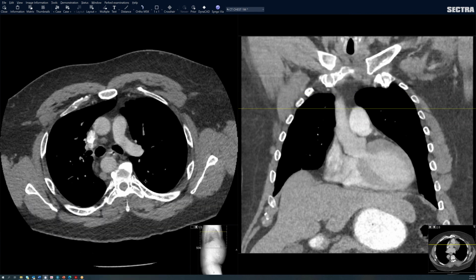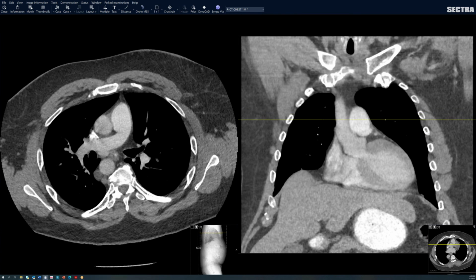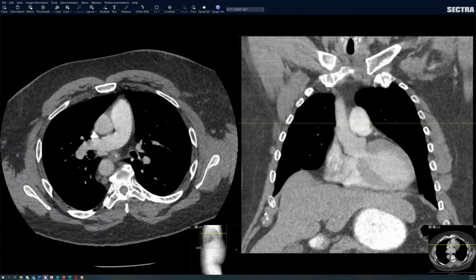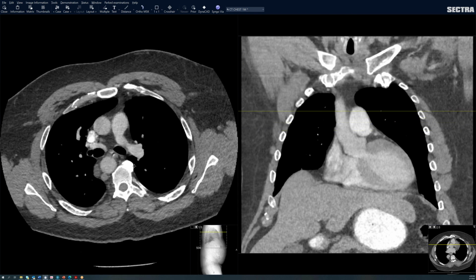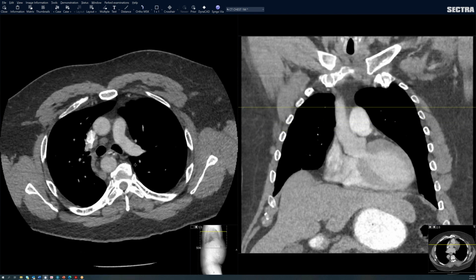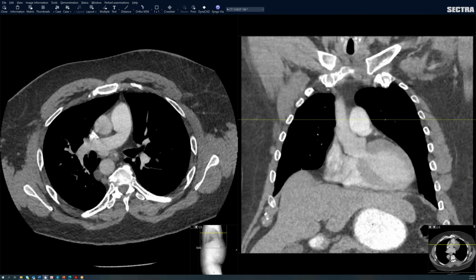The other thing that caught my attention, I was thinking crisscross, and I think we presented a crisscross case a while ago. If you stay at that image, there seems to be a kink at the origin of the right, and we saw that as well. Yeah, kinking. A few cases I've seen. Yeah, excellent, Jacobo.